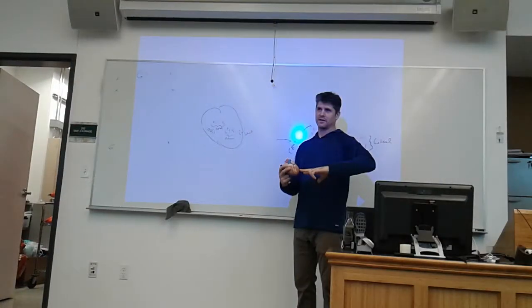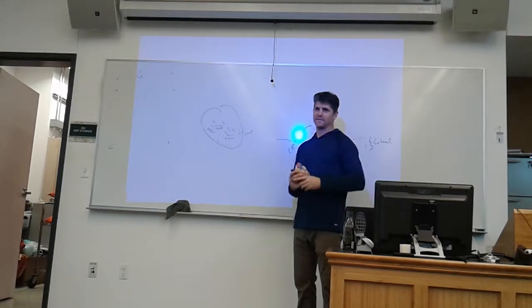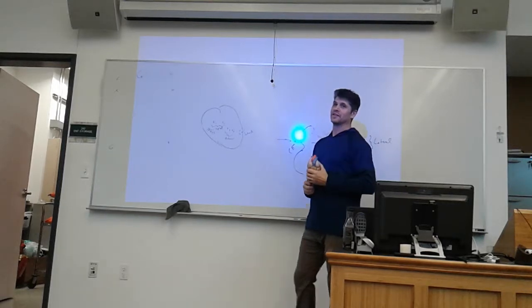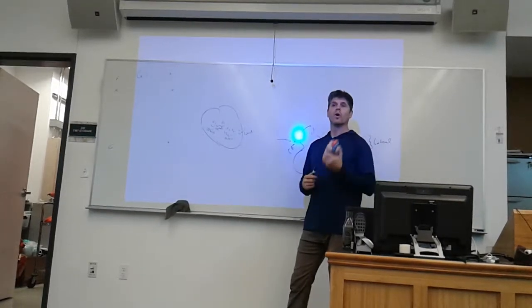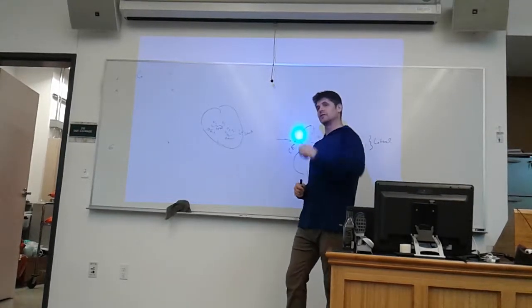You need to do all your three leads, or V1, V2 kind of focus to the center. Why don't we just move V1 and V2 to the back? You can. We call that a 15 lead. That wasn't the question, though. But if we're going to do it, let's just do it. We call it a 15 lead. But what would give you a clue that you even needed to think about doing a 15 lead?